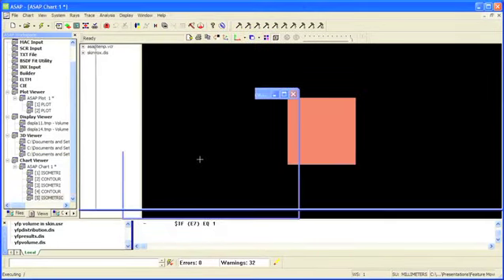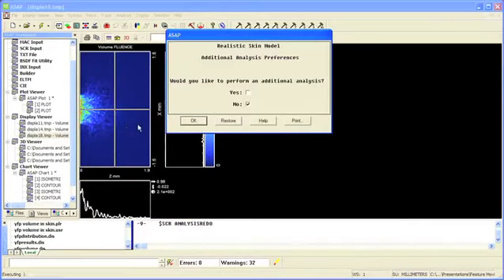Now our 3 display types will look a bit different from the display that we had seen before due to the fact that we traced a lower number of rays. The RSM also provides a method by which we can return to the analysis in order to perform an additional analysis on the same data set.